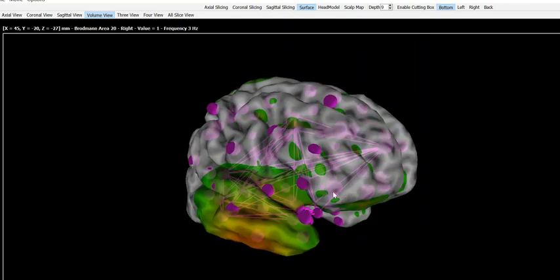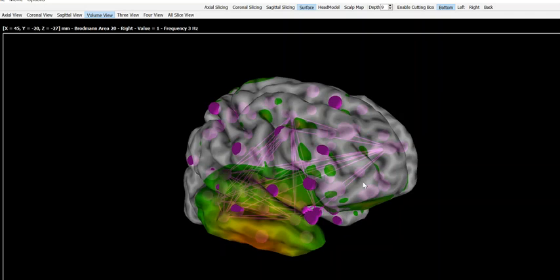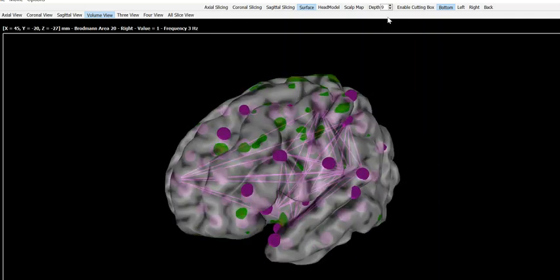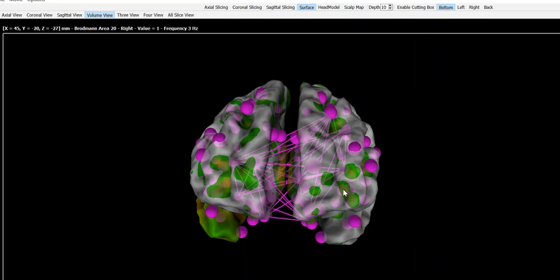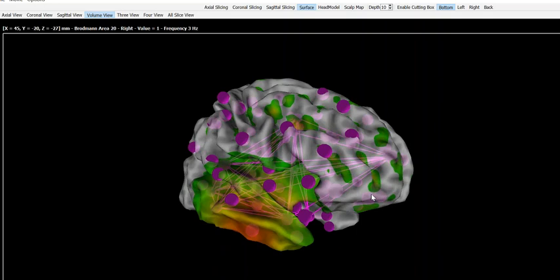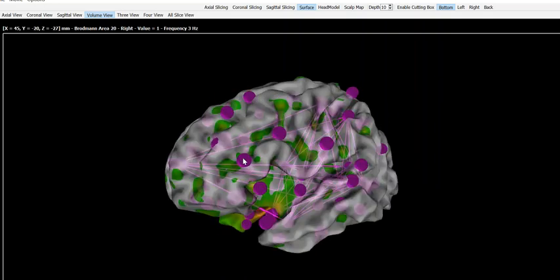connectivity. And of course, you can make the brain transparent so that you have only the connections, and then you can also add skull and scalp, as I mentioned, with the Laplacian surface or the electrical potential, and you can also go into the top and bottom of the cortex itself, although the connectivity only can be from the center of the Brodmann areas. It's not going to be changing for the upper layers of the cortex or lower layers of the cortex, just the center.